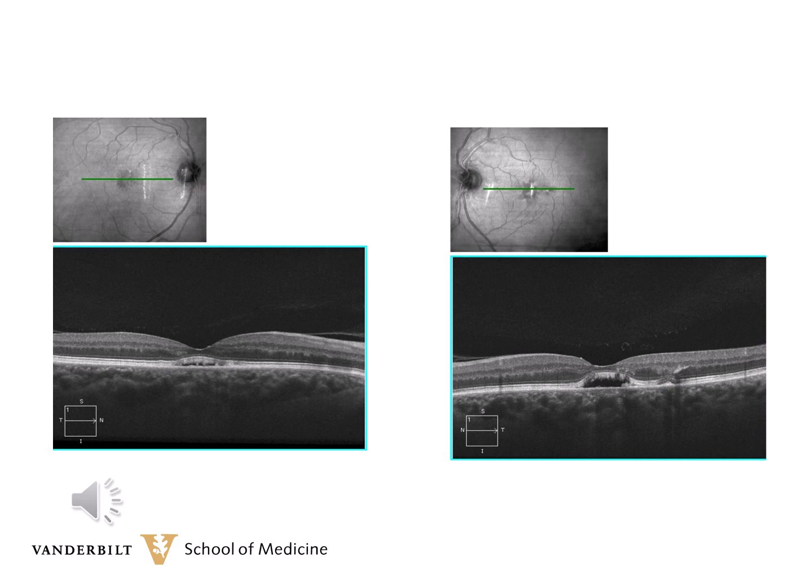And here is the OCT. The OCT of each eye shows liquefaction of a prior vitelliform lesion, and we can see this as a hyporeflective area under the photoreceptors. Again, this could be a central serous choroidopathy, and you could interpret it that way as well. But I think that this could be secondary to the vitelliform lesion.